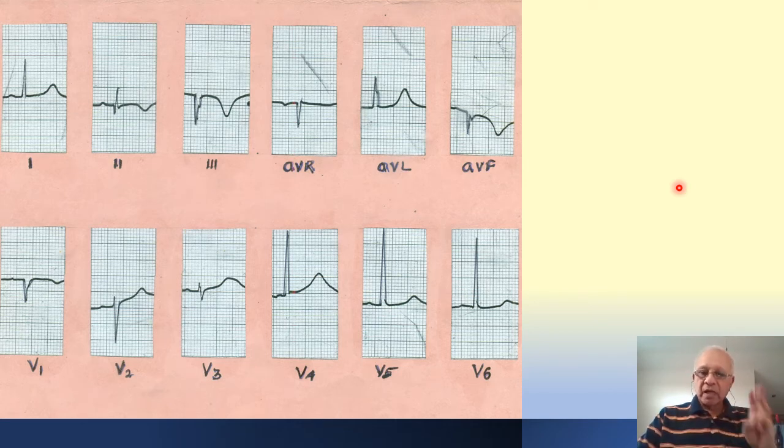The third thing is prolonged QT interval by itself can cause arrhythmias, isn't it? Especially tachyarrhythmias like ventricular tachycardia due to the prolonged QT interval. We have discussed this also in some of our previous ECGs. So all these three causes could be the cause of dizziness or syncope. Of course, there are other minor causes which can produce syncope in any patient with a myocardial infarction, but these are the important causes you should consider in this patient if he gives a history of dizziness or near syncope.